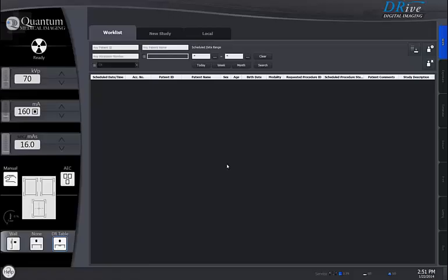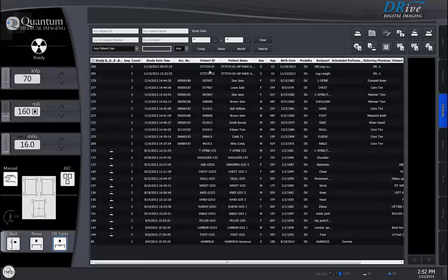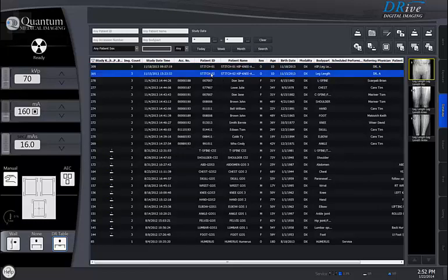In this video, we demonstrate the software side of the image stitching with your Drive DR. In this example, I'm going to query the database of prior patients. We see 2 patients where images have been acquired in preparation for stitching. If I was to choose the Insert Image button, it would load me into the exposure screen ready to acquire new images, or if I was to double-click it, it opens this patient into the viewer.